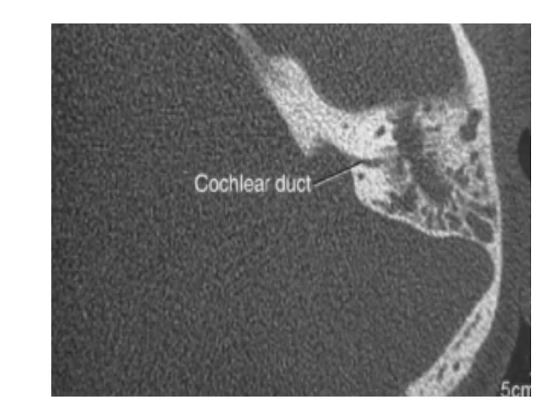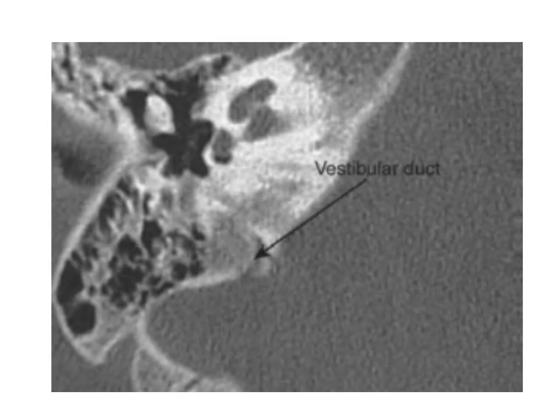This is the cochlear duct, and this is the vestibular aqueduct, which ends into the cranial cavity, not the brain, the cranial cavity.